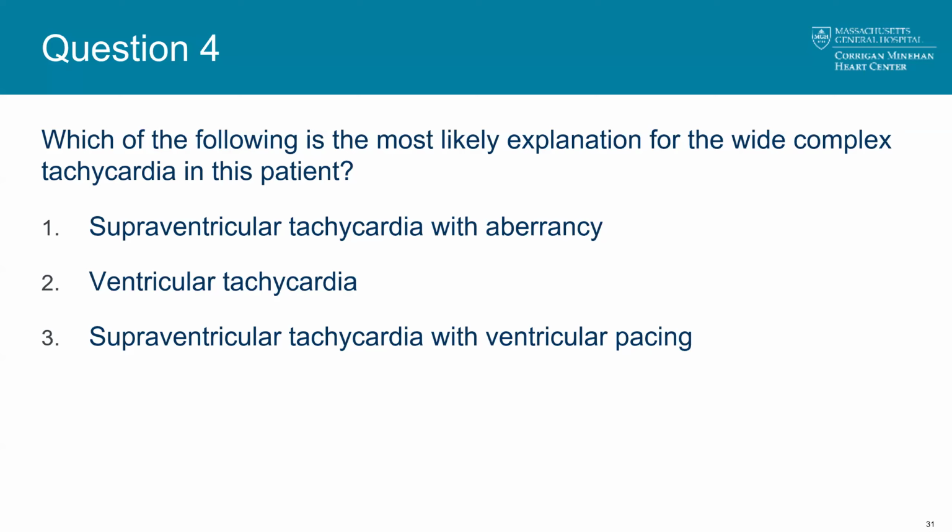But here's one non-EKG item that will force you to consider ventricular tachycardia as an option, and that is this is a patient with known ischemic heart disease, right, with a reduced ejection fraction. So this is a person with a high pretest probability of having ventricular arrhythmias. So if you've got a wide complex tachycardia and you can't make a visual ID based on the EKG, you've got to incorporate non-EKG findings, notably the patient's history and the findings on the non-invasive studies, right? That'll really give you an index of suspicion.